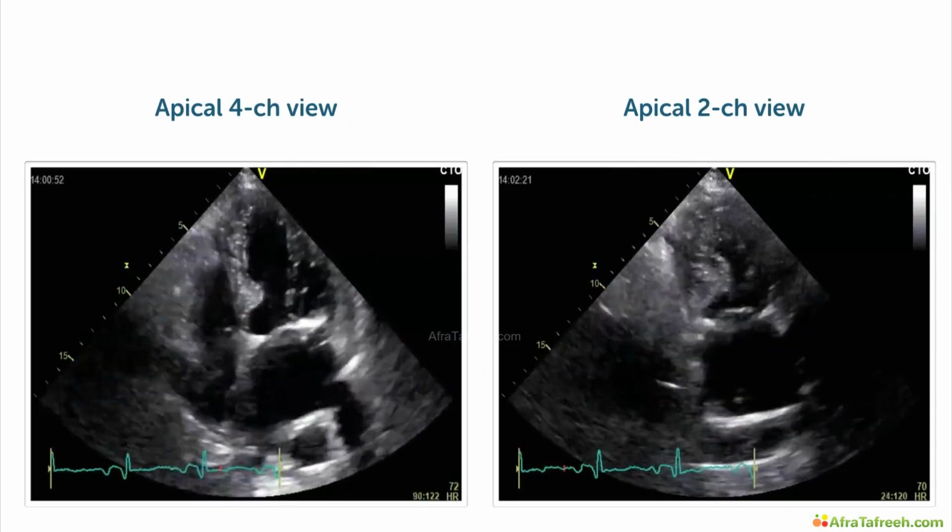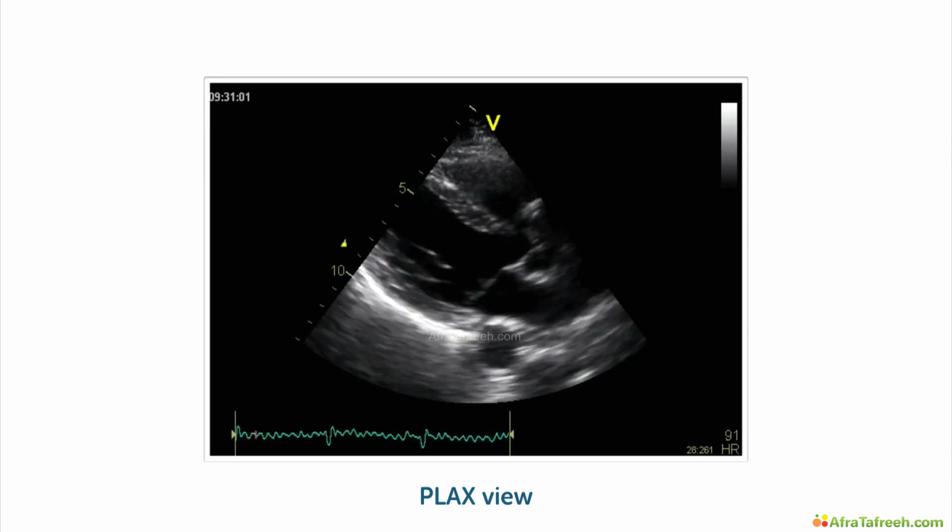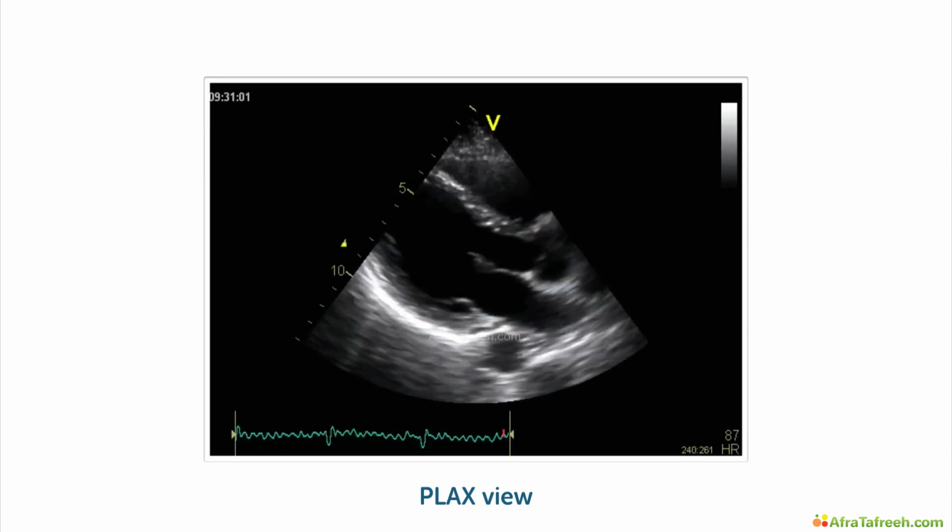Of course, transesophageal echo has a much better imaging resolution, but sometimes you'll see aneurysms there, and I've even detected dissections. So keep that in mind. This view is an adjunct to looking at the aorta.